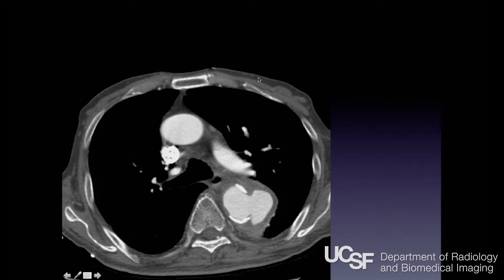So what is this? You have this dilated descending aorta here, but you can see that there's this sort of focal saccular outpouching. We see where the lumen should be, right? There's the calcification. We expect the lumen to be there. So there's this focal saccular outpouching with a narrow neck that looks like a pseudoaneurysm.